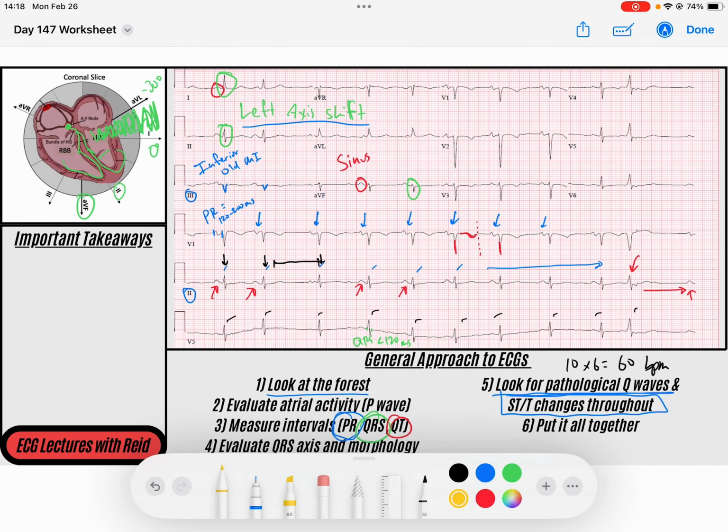If a little bit of the myocardium that's represented by lead 3 is damaged, well, my signal isn't going to be able to go that way. It's likely going to kind of, on average, go a little bit more to the left, right, throughout my QRS. But no active ischemia or infarction.